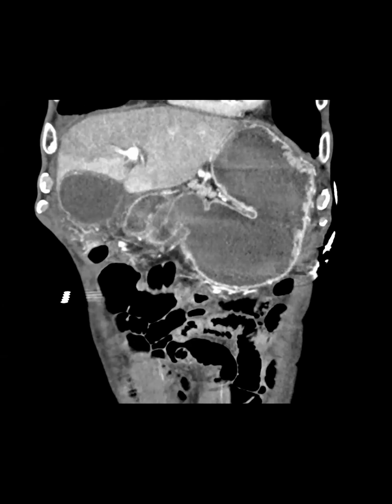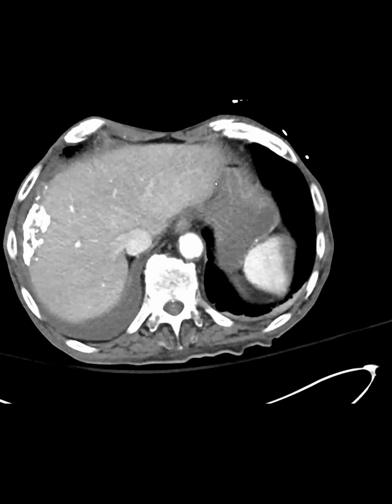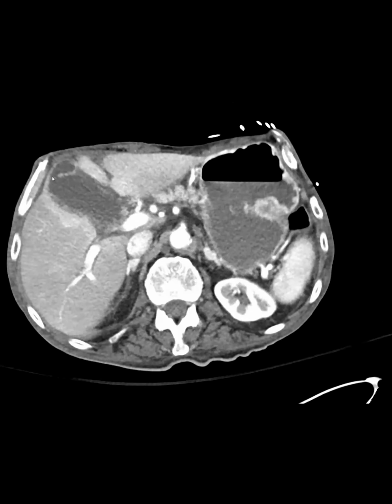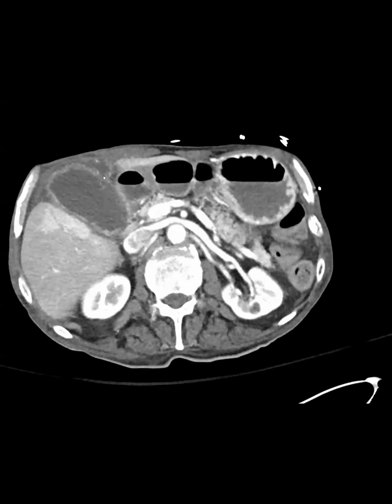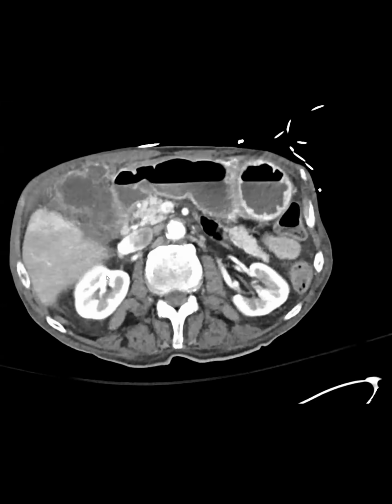Yeah, good. So this wasn't called initially. Great job. So this is actually just a fold in the gallbladder. That's not the finding, but you should basically be able to see, if you see mucosal enhancement, you should be able to follow it all the way around. You can see it here, and here you're losing it, right? And it gets all irregular. And there might even be a little fluid collection outside of the gallbladder.